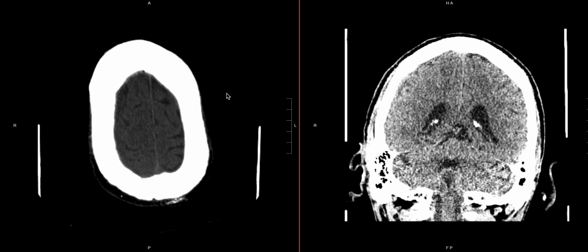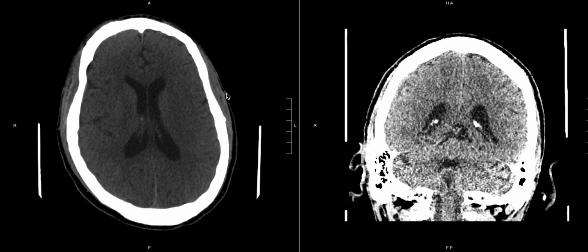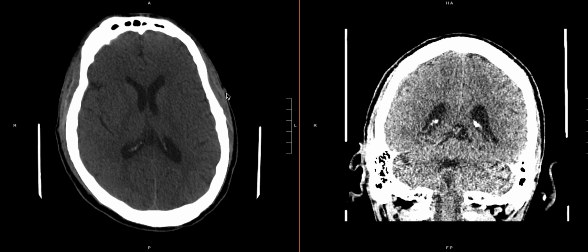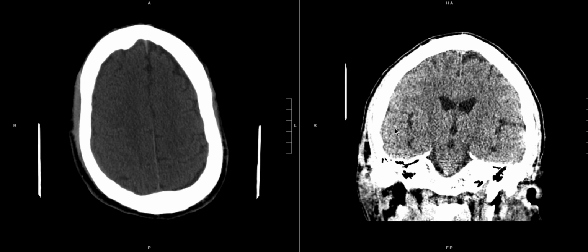And I'm just going to let you know off the bat that this is going to be one that's much more obvious on the coronal, not the axial. So it actually exists right here, and I know that because I'm familiar with the case, but also you may be able to appreciate how the brain parenchyma is pushed a little bit away. So this is displaced gyri here. So there's something extra, but we're not just going to make the finding there.